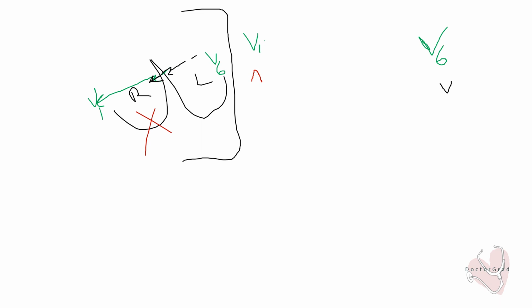This is our first deflection, denoting septal depolarization. In terms of V1, it seems like a small positive deflection. In terms of V6, it seems like going away from the lead, a small negative deflection. So that is what this means.